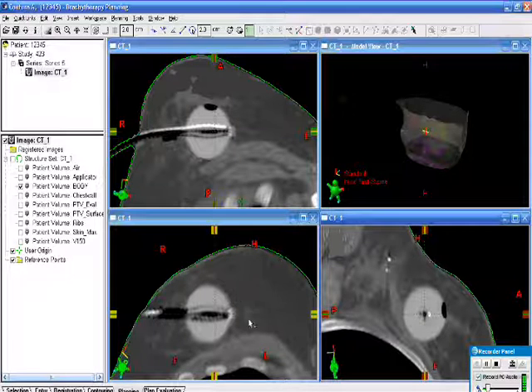The other view shows us channel 1 here. Maybe you can just make out this nitinol wire. It's not very prominent, and in some cases the nitinol wire is not prominent enough to even make out, so you sometimes have to be concerned about that a little bit. But in general, this is channel 1, this is channel 3, channel 2, channel 4, and we can see channel 5 in both views, so we can reconstruct from those.